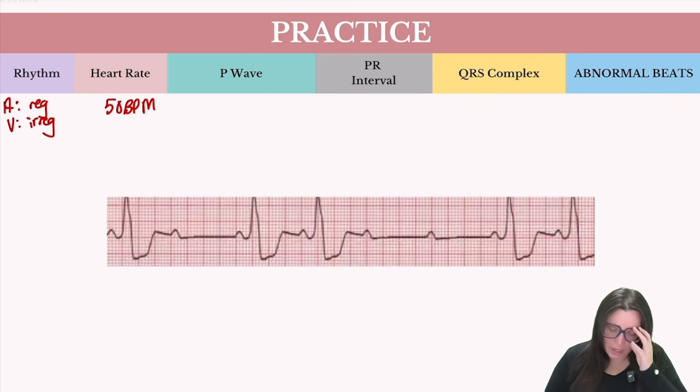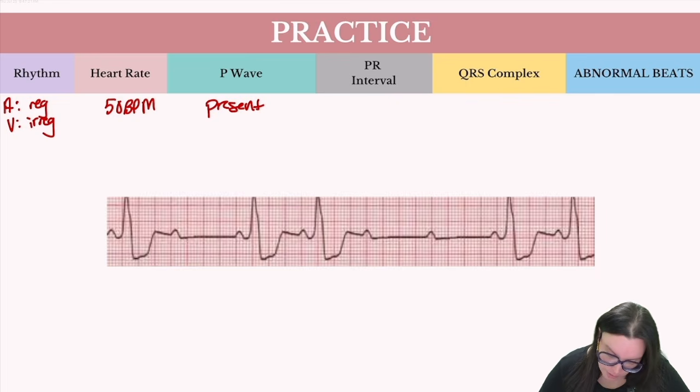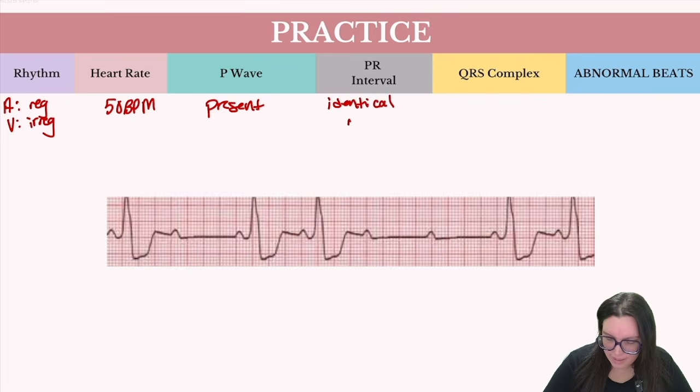It's a little slow. Do I have P waves? I absolutely do. They are present. But what's interesting about these P waves, let's take a look at our PR intervals. So here, when I measure this one and compare it to this one, compare to this one, compare to this one, they are all identical, right? So they're identical when they are present.